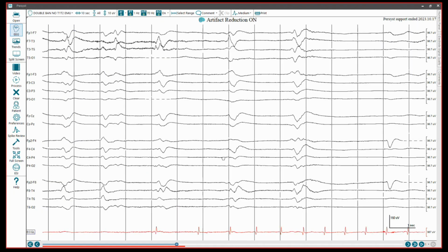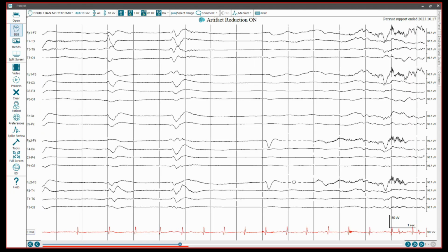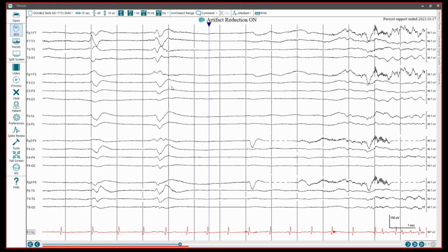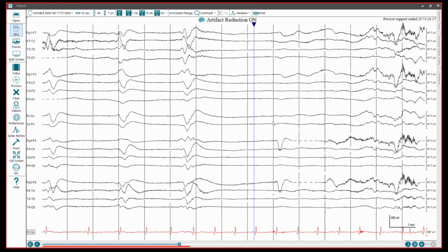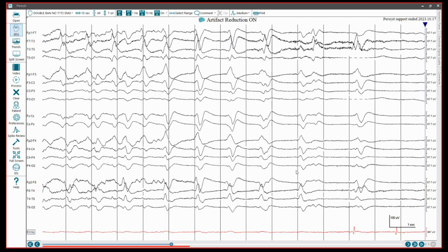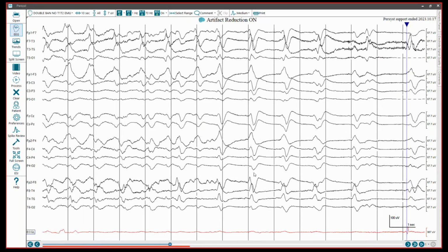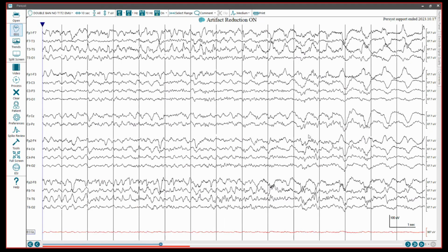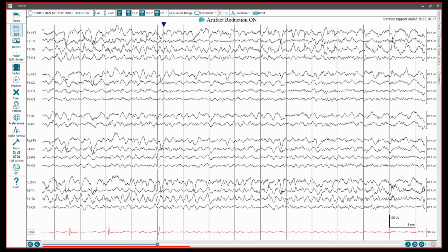Notice that the heart rate starts back right here. So there's quite a while without the heart pumping blood. So we had cerebral hypoperfusion, hypo meaning less or lower than something should be, not hyper, but hypoperfusion. So you'll see a dropout of faster frequencies. That is the first frequency band to go when there is a loss of blood flow, say from an anoxic event or a stroke, you'll see the fast frequencies disappear first. And this kind of mirrors sedation too. With sedation, you see the fast frequencies drop out first.